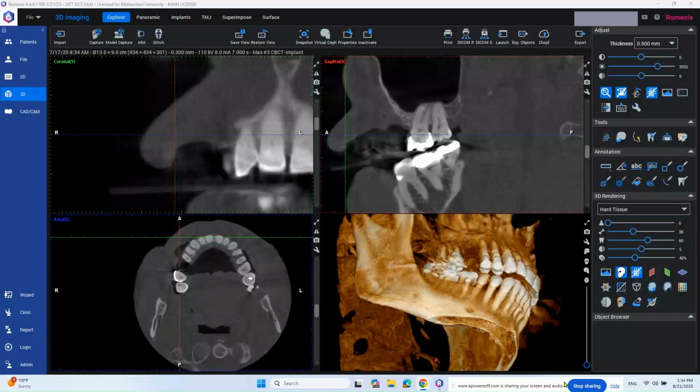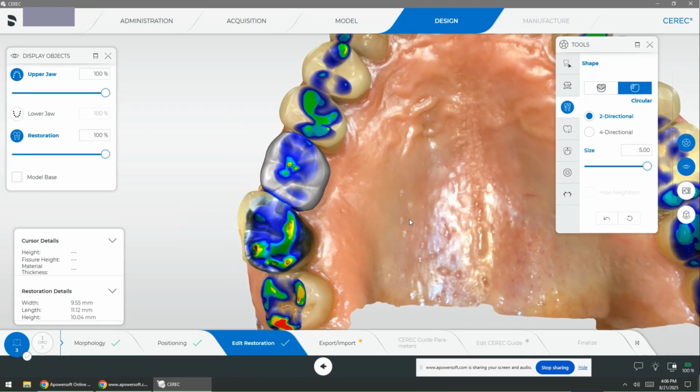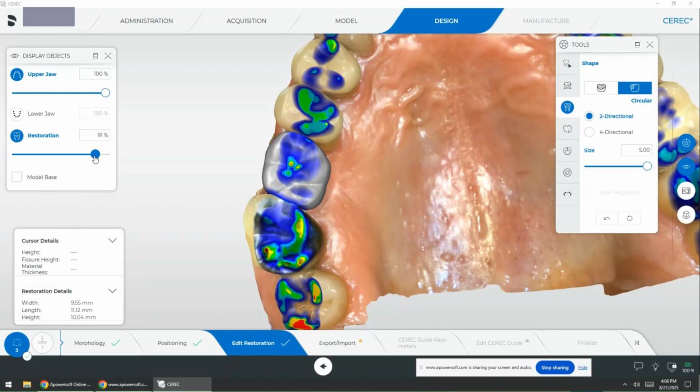Okay, I'm going to go over how to implant plan using a generic tooth inside Romexis. Now, a word of caution, using a generic tooth means that you don't get occlusal data when you plan this tooth. You get an idea, but it's not definitive.